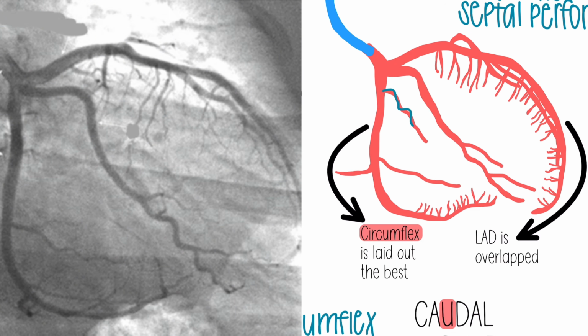And then this one right here would be OM1, because we go in direction of blood flow, OM2, and then this right here is a PDA because it has septals, but if it didn't, you'd call that OM3. This is the proximal circ. And then this, it's going towards the AV groove. The AV groove is the distal circ.